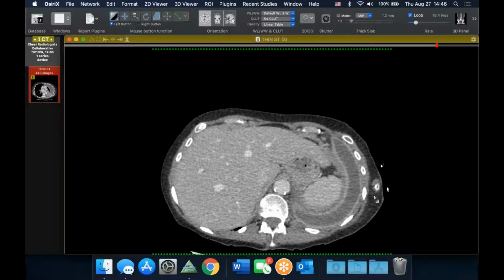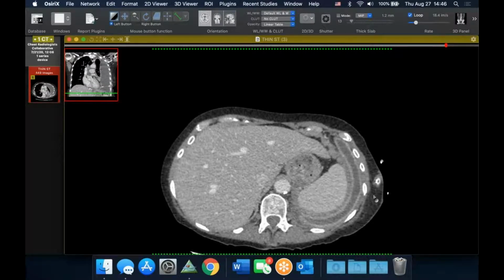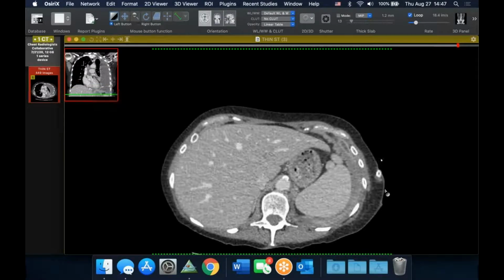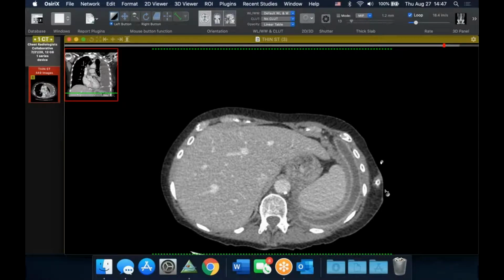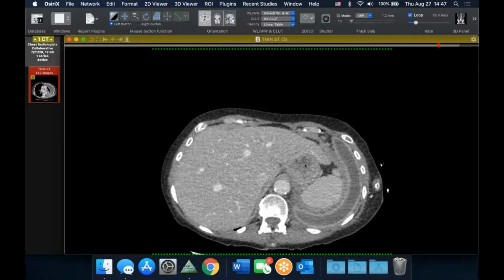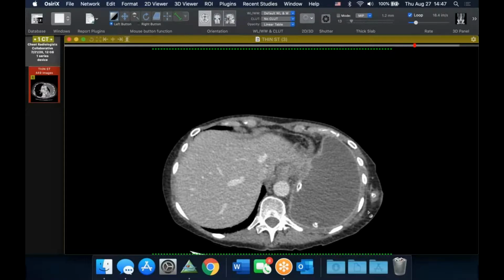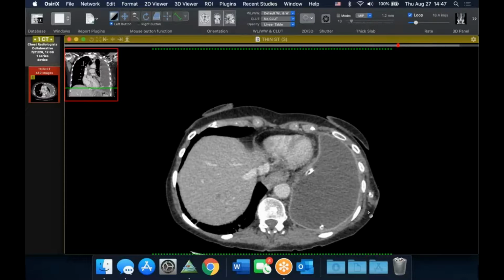So I suspect it's an infected chronic pleural effusion that's tracking along the drain, and you can see a little bit of cellulitis there. And that's something I've sometimes not really thought much about, but I guess the equivalent we do look for is with LVADs. When you can see driveline infections, you can see just some stranding around the driveline. But in this case, we actually have what looks like contained fluid. Interesting, the fat around it is fairly clean. So I wonder if it's formed a little track.